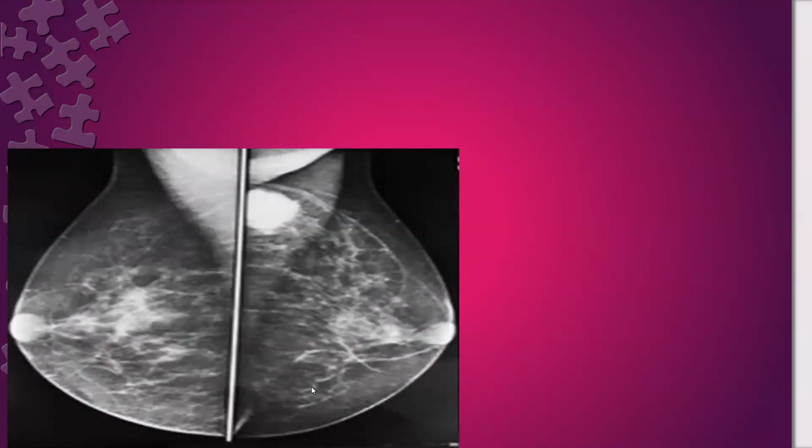Any volunteer to comment on this mammogram? Try to be quick. Okay, who?